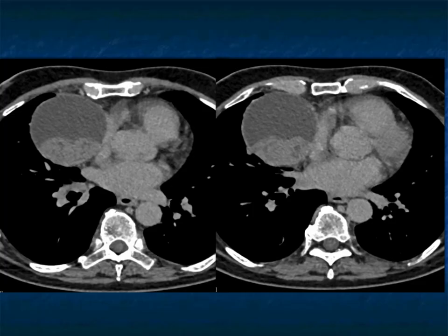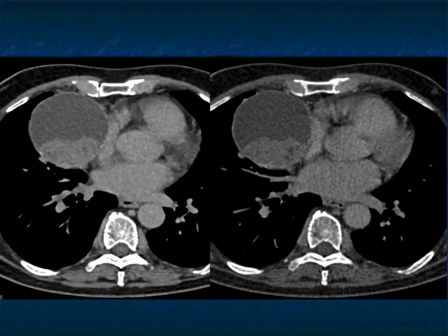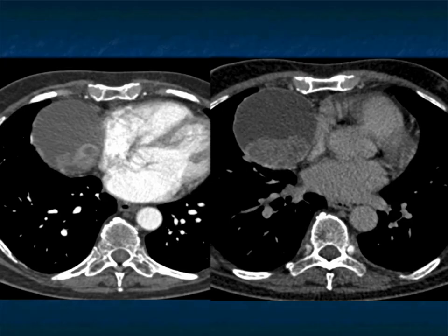If you have a thymic cyst and it bled, which is not that rare, you can see soft tissue simply layering out. But for a thymoma, I don't like it. Cystic thymomas we talk about, so I guess it's in that differential. This was resected. This was a teratoma.